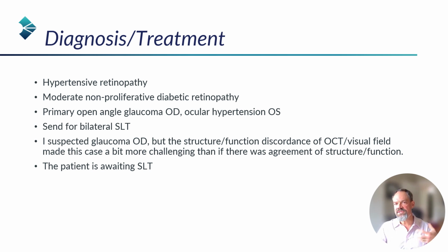So I wanted to get another objective test, and that's really where the ERG came in. And so we saw a reduction in the A wave that I showed before, but the PHNR, which is a measure of ganglion cell function, really showed a large asymmetry between the right and left eye. And that really is kind of what clinched the diagnosis here.